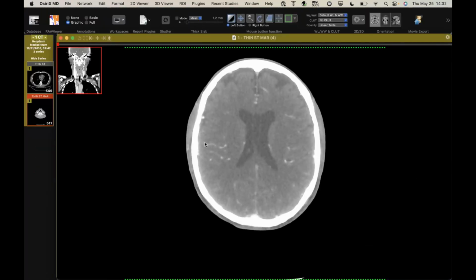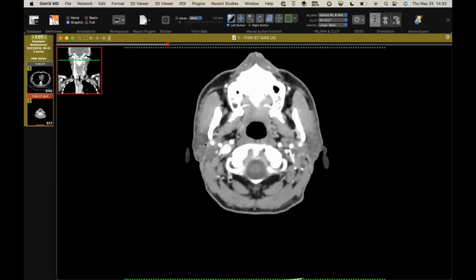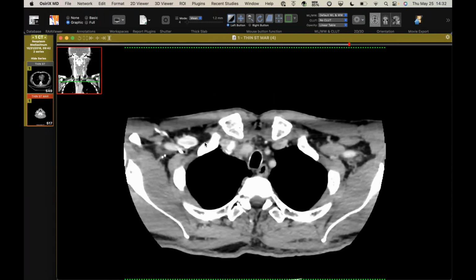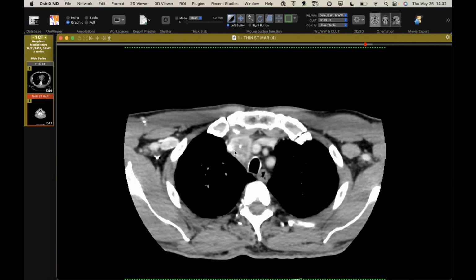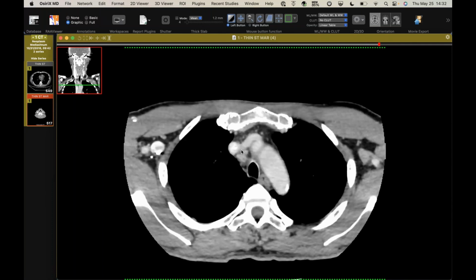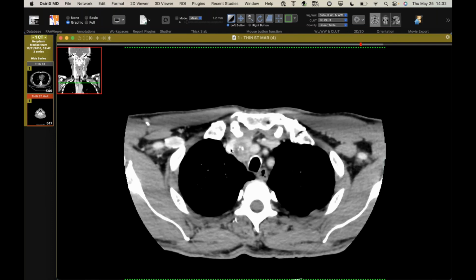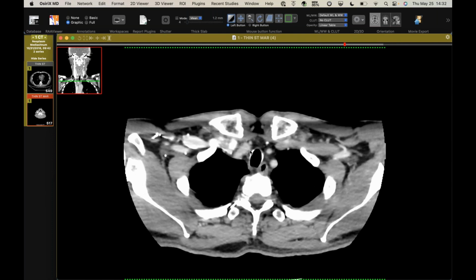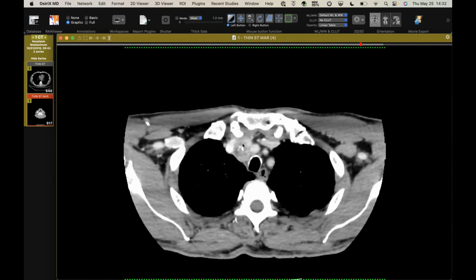So this is an interesting case, just from a pathology standpoint. I don't remember why the next CT was done, but for whatever reason, this was identified on the next CT. You can see there's this heterogeneous peripherally enhancing mass. It's got some calcium in it, located in the upper mediastinum. It seems to be abutting the brachiocephalic vein on both sides and up against the arch. And you can see it doesn't seem to attach to anything else. So it's kind of just hanging out here. Now our next CTs are sort of a dual phase.